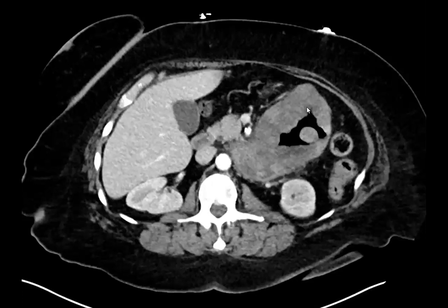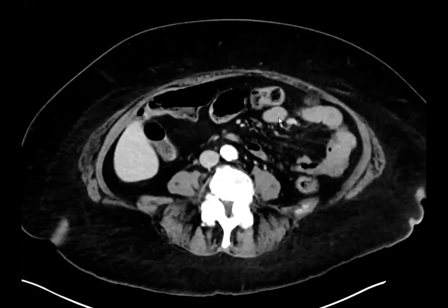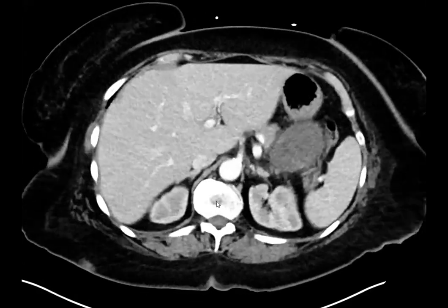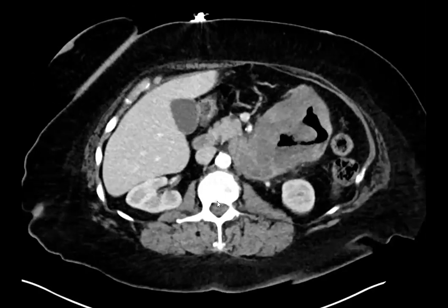Excellent. So I would have thought lymphoma near the top, because lymphoma likes to thicken the bowel wall and cause aneurysmal dilation without obstructing the bowel. So this is a really good look for lymphoma. But with lymphoma, you might see other lymph nodes around in the retroperitoneum, like it's not usually just isolated to the small bowel. Anything else?